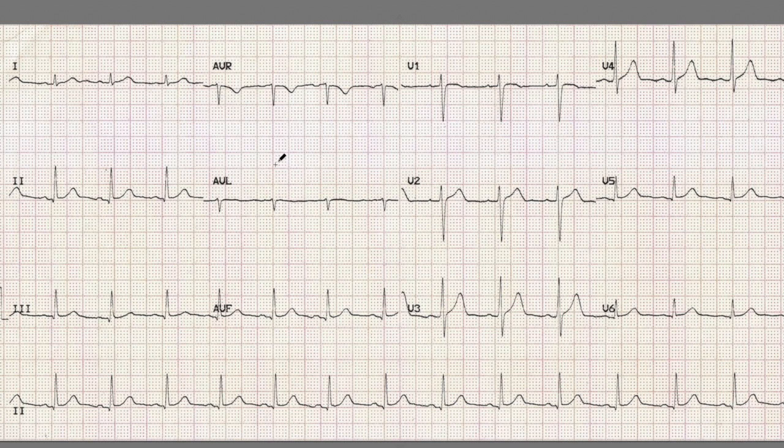Here's an ECG that I've pulled out from lifeinthefastlane.com. It's an excellent website, and all of my diagrams are from their website, and I'd highly encourage you to have a look at this site. Very broad, and it's just a fantastic site for not just ECGs but everything else.